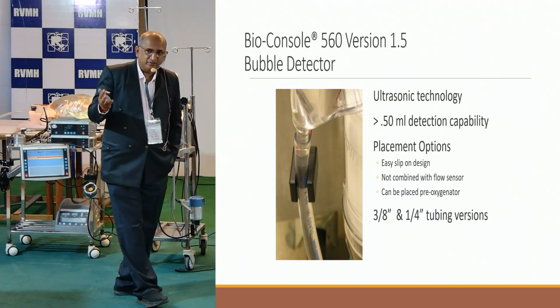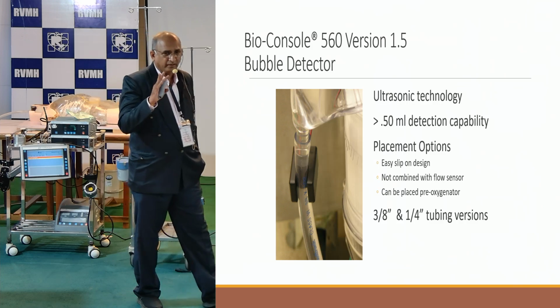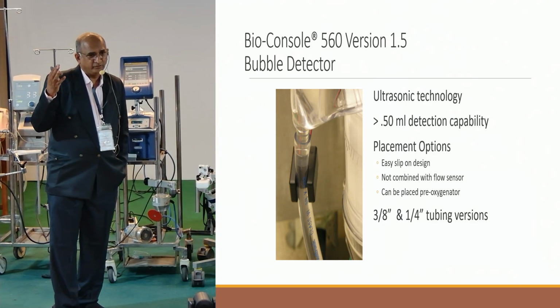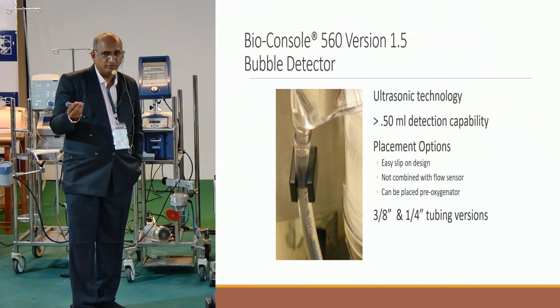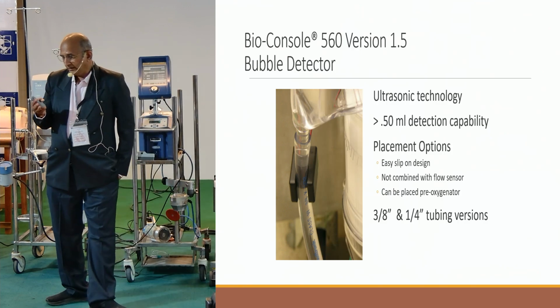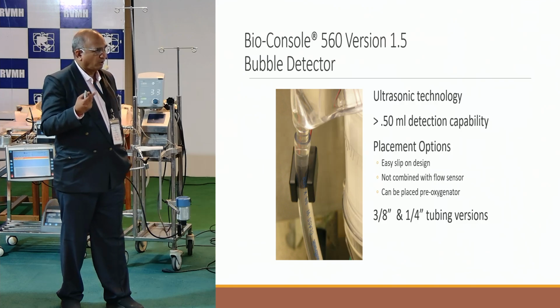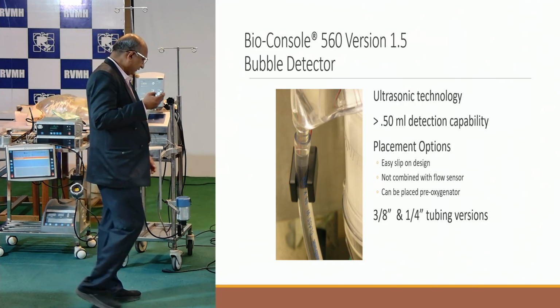Then you have bubble detectors. Most of the bubble detectors are incorporated with the flow sensors. So when they sense the flow, they also sense the bubbles. So that is the bubble detector with the flow sensor. With Medtronic, you have separate bubble detectors.